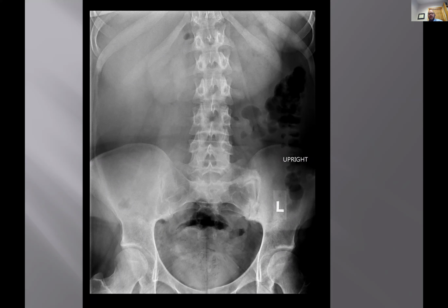Now this is harder. I want you to detect again, or just describe where you're seeing the finding now. Of course, there's the viewing, there's the left side of the patient. Where is the finding here?